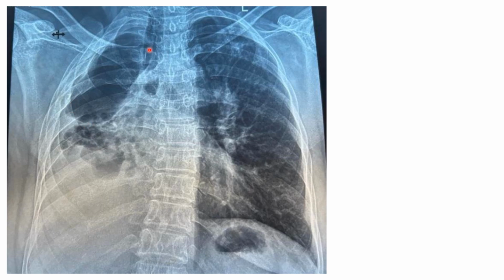You have to remember some cavities are so large. So this is very important when you put ICDs. When you see something like this, you have to differentiate between a cavity and a pneumothorax sort of thing. Here it is a cavity.